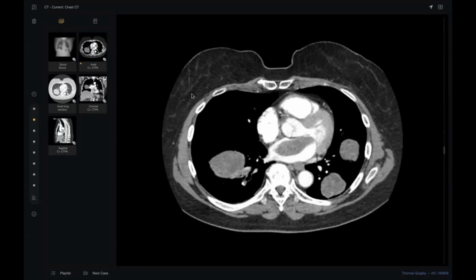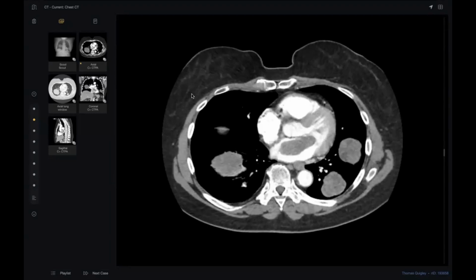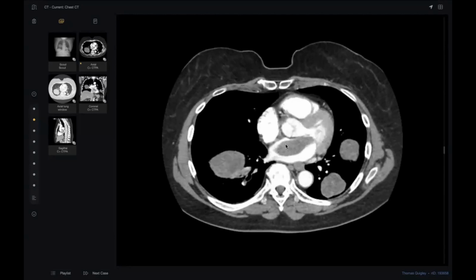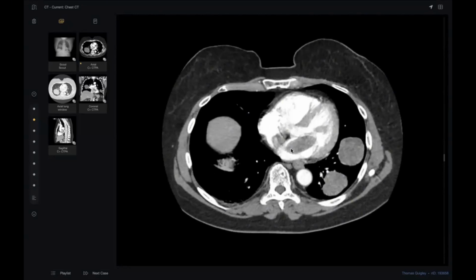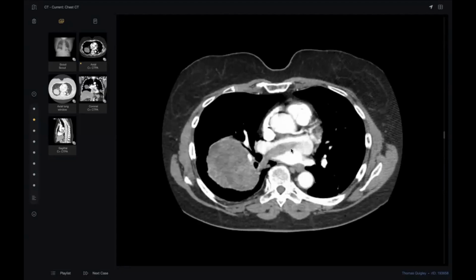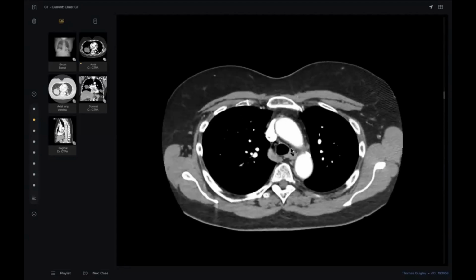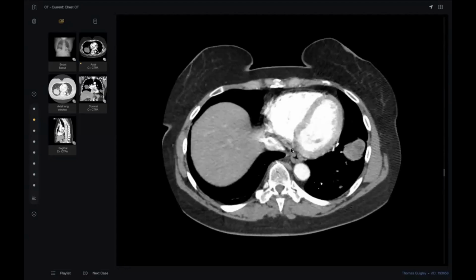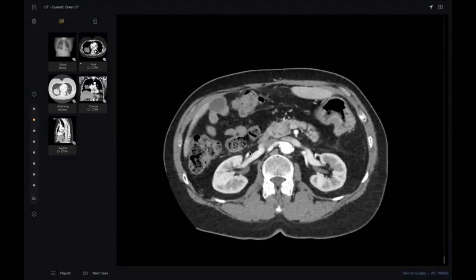See, one second. Sometimes our colleagues, most of us, take too much time describing a very obvious lesion and forget this big disaster. Okay, tell me. So the lung lesions could be representing metastatic processes, and the left atrial filling defect could be representing a bland thrombus or a tumoral thrombus. Looking for mediastinal lymph nodes, I cannot detect any lymphadenopathy. I would like to check for pulmonary emboli. What will you do next?